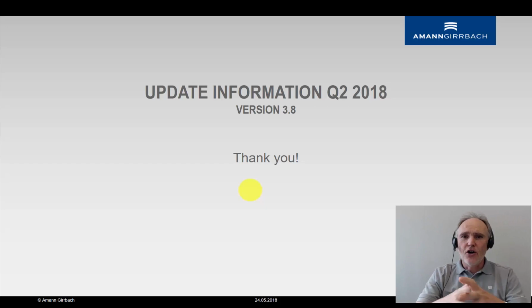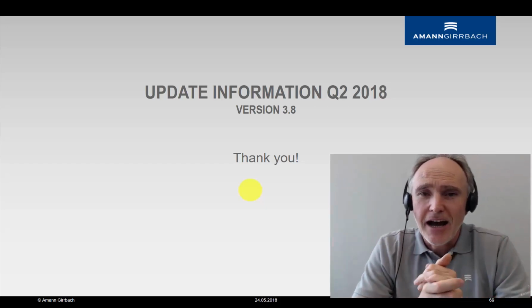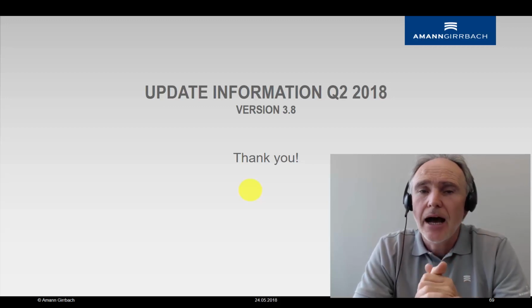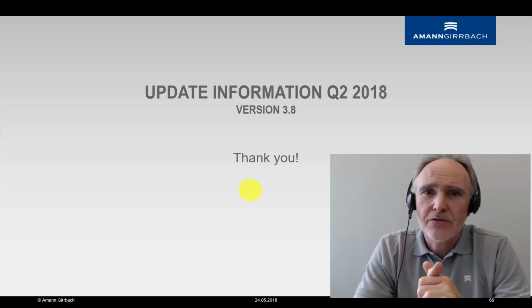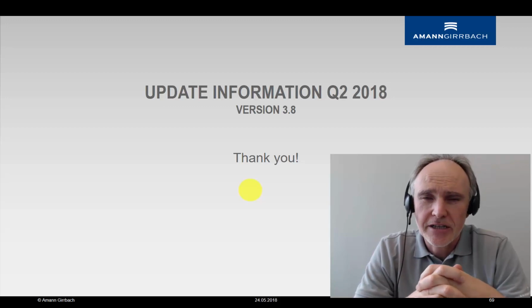That now is all the latest things in the software update. You see, it's a big package. I'm happy to have introduced you to the new features. I hope you enjoy it, do the software update and work with these new features. And if something is open, if you have some more questions, contact us.